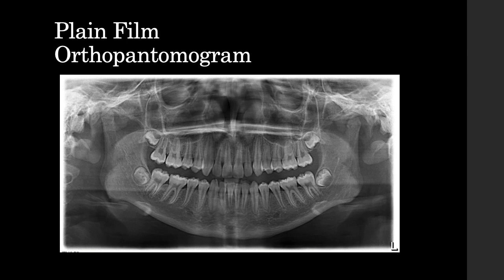But you can actually tell that detail because you can see where the jawline is, you can see where the bone line is, and then you can see the crowns of the teeth as well. And you get quite good views of the inner pulp of the teeth, but I'll come on to that anatomy more later. It should be said, of course, we usually do an OPG for either dental abscesses or mandibular trauma, but if someone's got a clear fracture and we need something for surgery planning, we would do a CT. Most surgeons nowadays will want a CT, they'll want the 3D reconstruction to actually plan their surgery with.